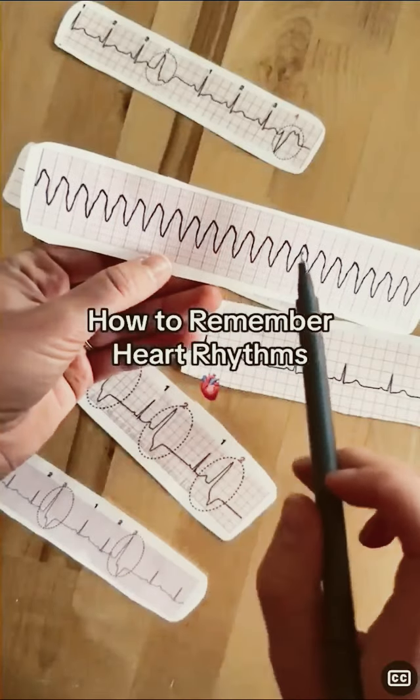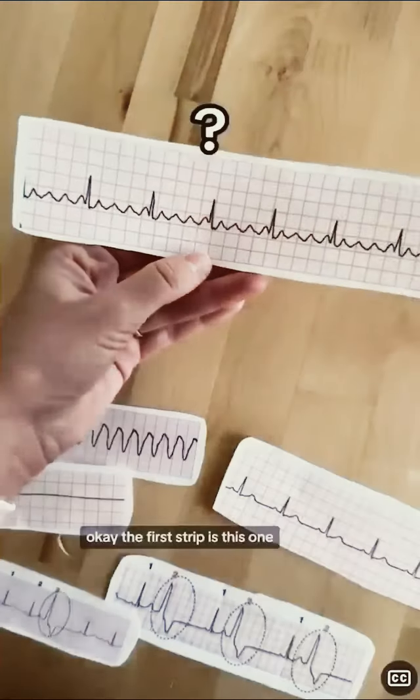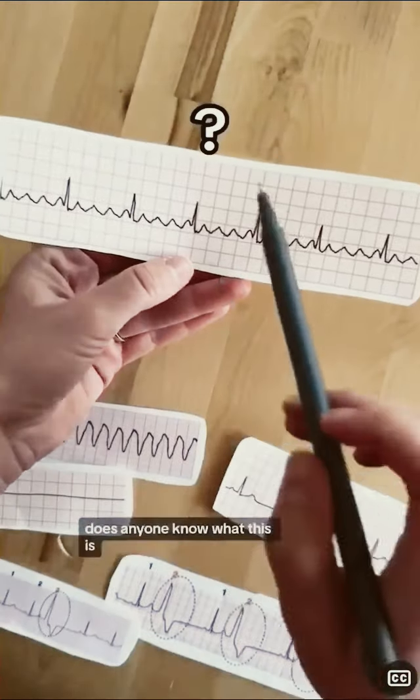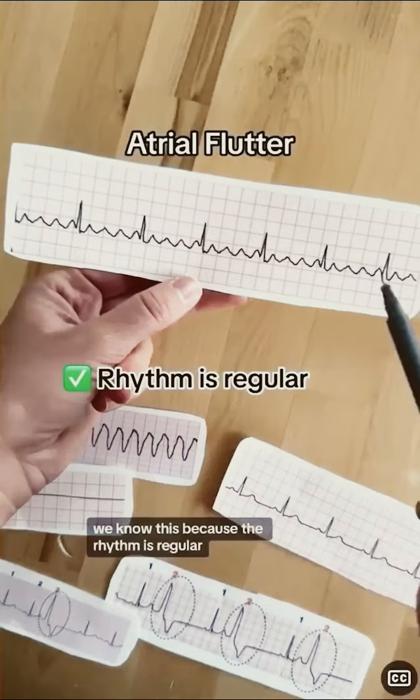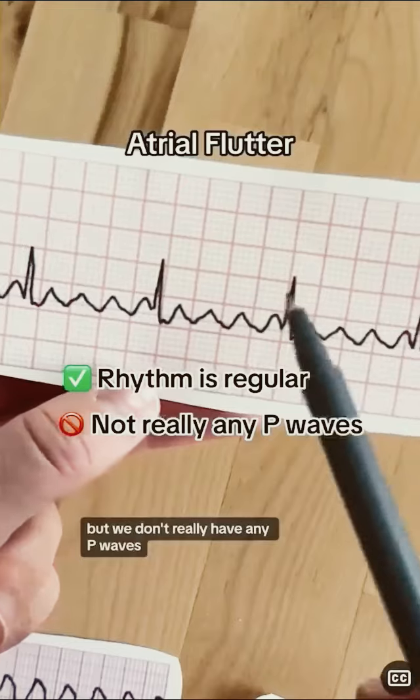Knowledge on EKG strips. Okay, the first strip is this one. Does anyone know what this is? This is atrial flutter. We know this because the rhythm is regular, but we don't really have any P waves.